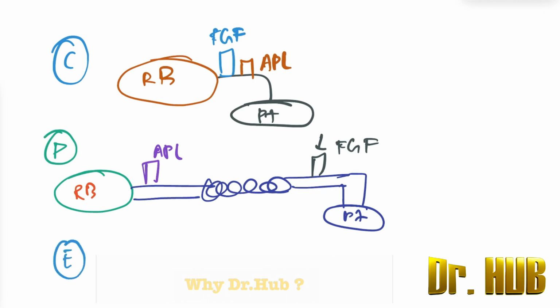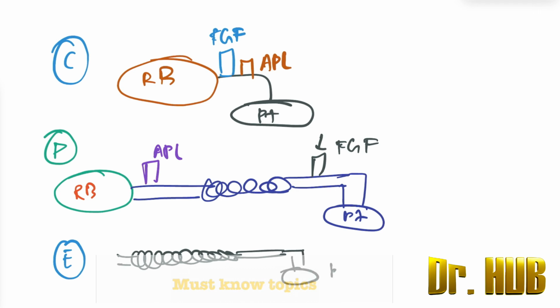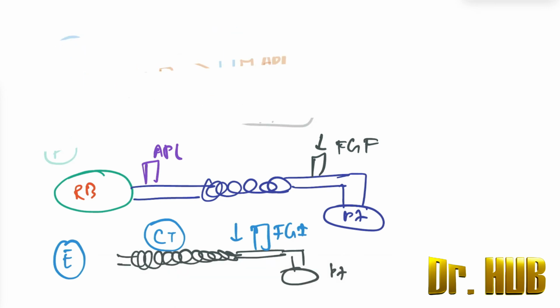Next we move on to type E, the Mapleson E. In terms of Mapleson E, there are corrugated tubes, and then there is a patient. E is looking very incomplete. There is just the FGF, the patient, and the corrugated tubes, which looks very incomplete.